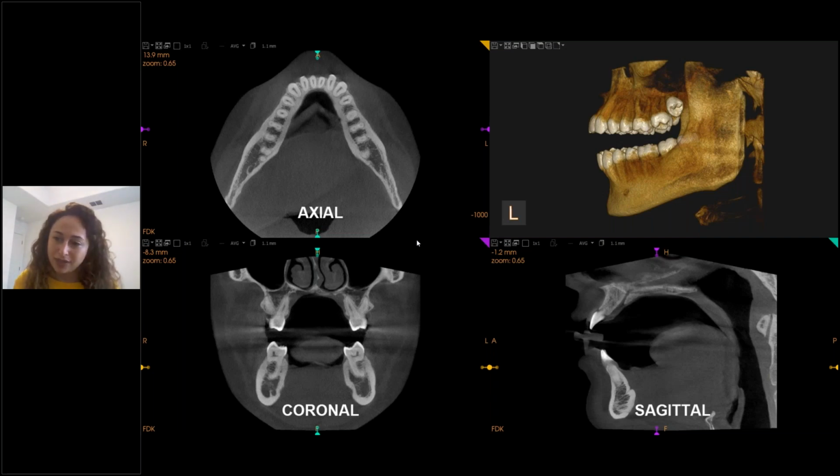So if you were using the older version of the software, which, and I think you can correct me if I'm wrong, but I want to say it's 3.10.35, that's the older version, then this is what you see under oblique slicing. And the newer version, which is 3.10.38, you would see this under MPR, multiplanar reconstruction.